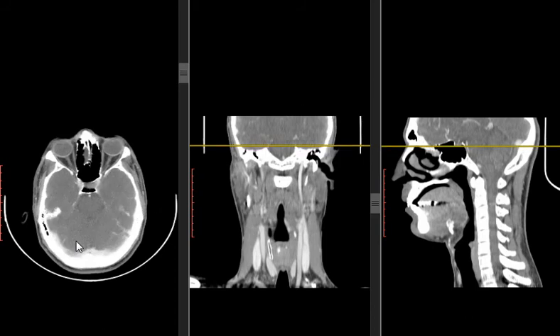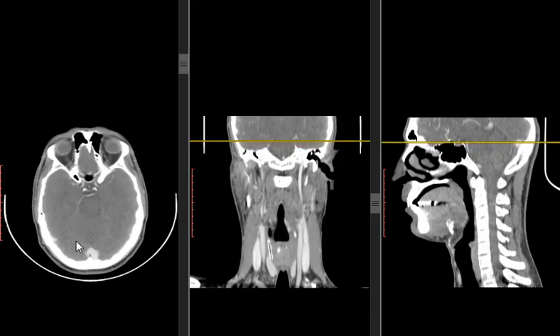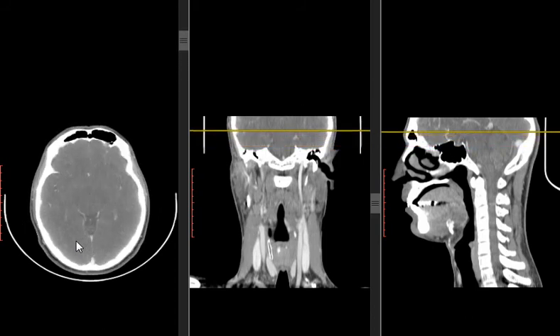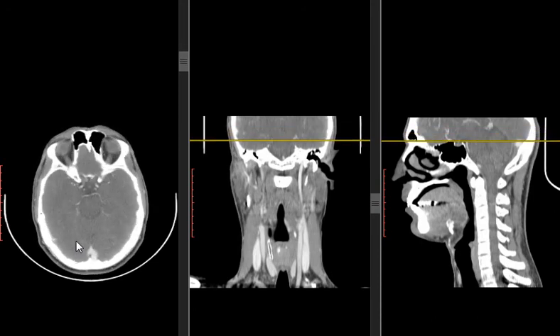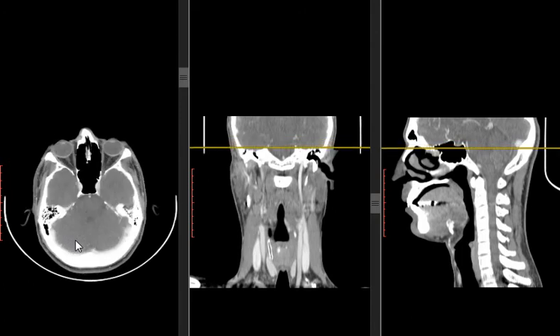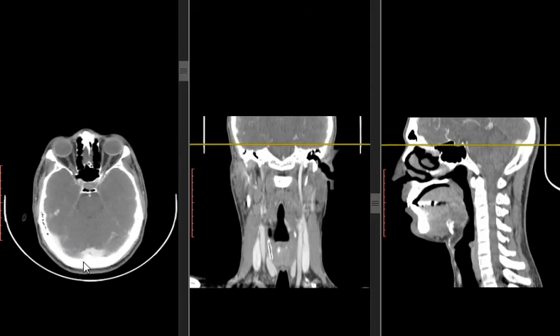Soft tissue window. Yes. Coronal, axial and sagittal. Yes. First of all, Khaled, is there a native scan? I don't have a native. We don't have a native. Of course, good question, you get score for that.